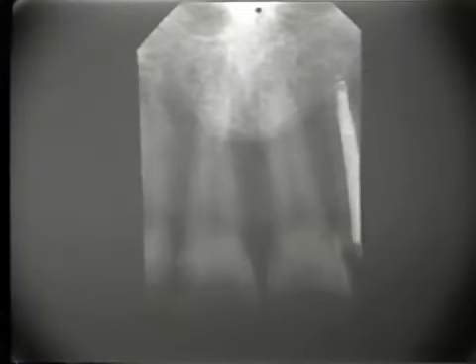Next we go to a radiograph that shows what would happen if she had not closed her lips. You notice the lower part of the tooth is very, very dark. It recorded so very dark on the radiograph by virtue of its thinness. All the rest of the tooth is covered either by lip and bone. So to equalize this inequity, we draw the lip down to protect the thin incisal edge from excessive exposure.